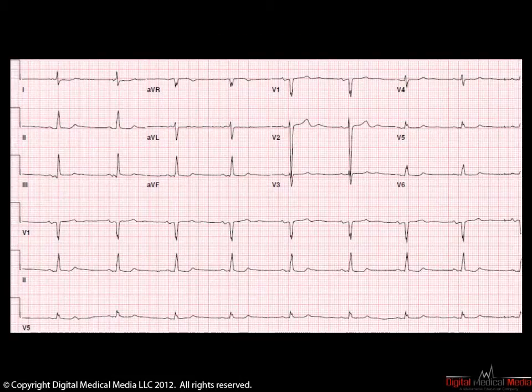This 12-lead ECG was chosen because of the presence of prominent U waves. U waves are abnormalities in repolarization which appear after the T wave. They can be quite similar in appearance to the T waves themselves, but are usually distinct from those waves. In this 12-lead, leads V1, V2, and V3 manifest very prominent and clear U waves.